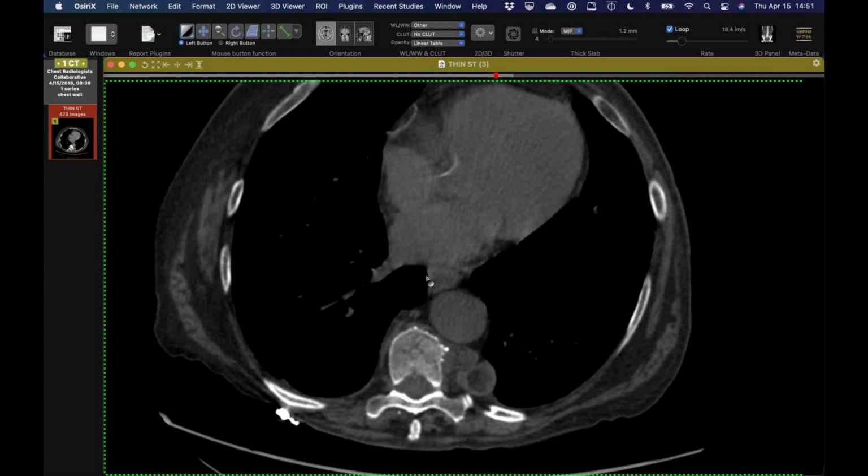But before I dug into it, I thought it was kind of interesting because it looks like it definitely has fat in it. I couldn't tell if this was a fluid level with fat and liquid, or if this was just pockets of fat.